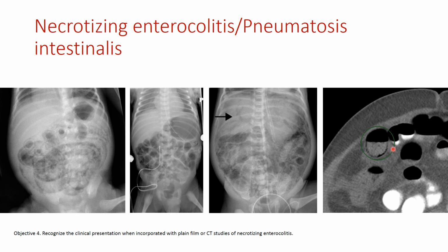On CT scan, again, you see these little bubbles of air within the bowel wall. This is air within the lumen. Okay, the air within the lumen will tend to rise in the patient supine, so the air tends to go upwards while the fluid tends to go downwards and make this air fluid level. But this air is trapped within the wall, so it can't really rise.